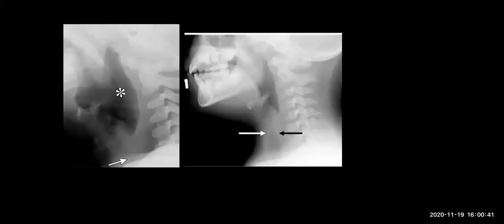On the lateral radiograph, again, you can see the changes of subglottic inflammation, which is usually, as I stated earlier, related to infection with viruses. And you can see, as I mentioned, at C5-6 there should be slight narrowing, but not that much. So this is an abnormal narrowing. In addition, you can see the hyperdistension of the pharynx superiorly and proximal to that narrowing. This indicates inflammation of the subglottic region in a croup patient.